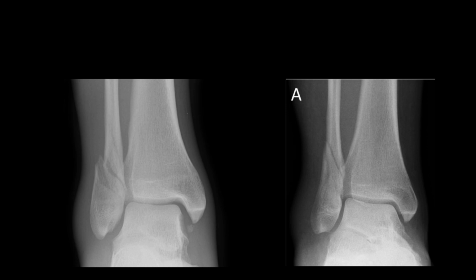I want you to pause the video and see what stands out. So hopefully you'll have checked this and you can see that when we're looking at alignment, there's our area of overlap here. When we're looking at the alignment of our joint over here, what should hopefully be clear is that once we get here to the lateral portion of this x-ray, we have a narrowing of the joint space here. Whereas if we look on the x-ray on the right, the joint space remains a lot more consistent. This suggests that in this x-ray we have a degree of talus shift laterally, suggesting an unstable fracture.